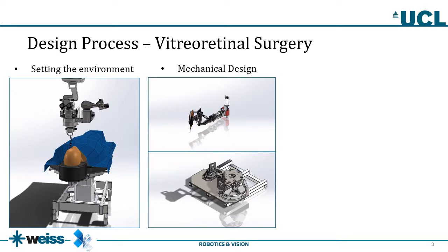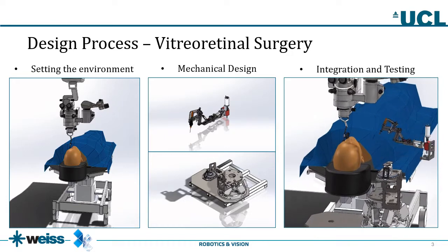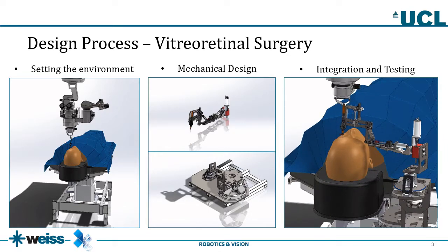taking into consideration the spatial conditions that exist in the operating room, and of course by following the presented process to motorize the parts of the system for which we believe that custom solutions might be more appropriate for the needs of this application. The final step includes integration of the designed robotic tool into the surgical environment and testing in order to ensure that the robot's function is within the range of the constraints imposed by the environment itself.